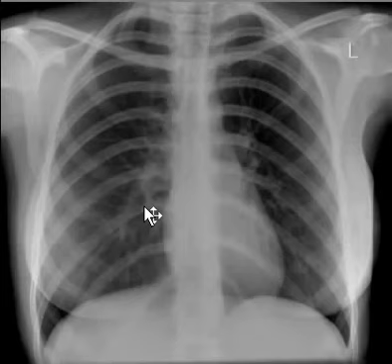This suggests that a patient does not have any emphysematous lung disease. Both diaphragms are making a dome shape, again to confirm previous suggestion. Lung parenchyma is visible in retrocardiac area to suggest that left lower lobe is not collapsed. All other lobes are normal as well. The heart size is roughly less than half of the thoracic diameter, to suggest that there is no cardiomegaly. Radiologists have electronic tools to measure the cardiothoracic ratio, which we unfortunately do not have.